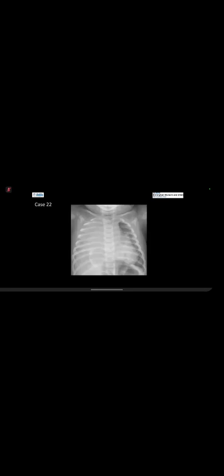So this patient had a CT, okay, hang on. I've been provided with coronal and axial reformatted images of a contrast CT chest showing a heterogeneously enhancing lesion with calcifications and fat densities occupying the entire right hemithorax, causing contralateral mediastinal shift.